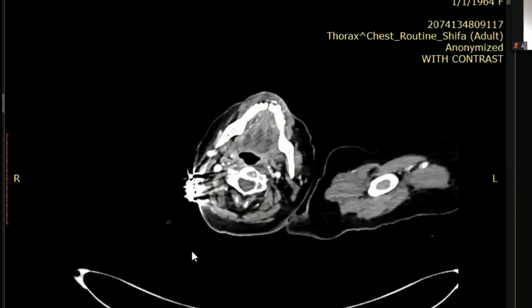So this is the CT scan. It was nice, just don't worry. The take-home lesson is that you will practice. Number one, you will follow a similar checklist every time you look at a chest X-ray. It's not that you will start differently for every other chest X-ray. You will have a checklist in your mind for a cancer. You will have a checklist in your mind for infection.